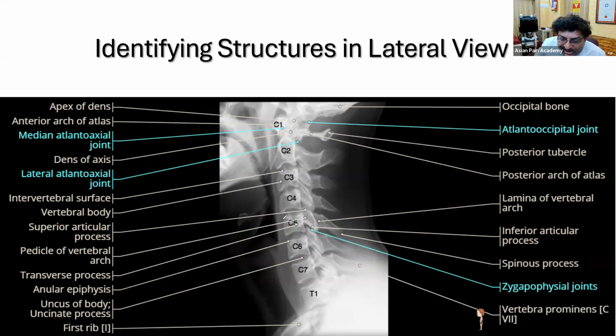Now, if you look at these small boxes on the anterior side, we all know there is nothing special. These are the vertebral bodies. And after the small boxes, we have these blue rhomboid-shaped boxes. So what are those? These rhomboid-shaped boxes. This blue box, what is this area?